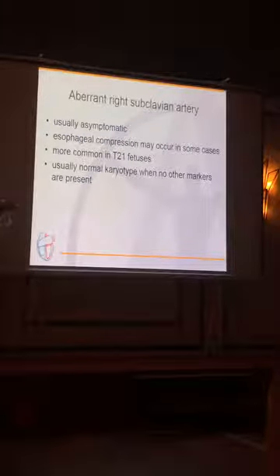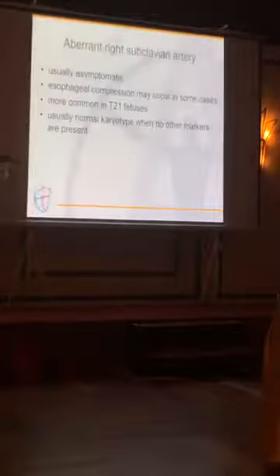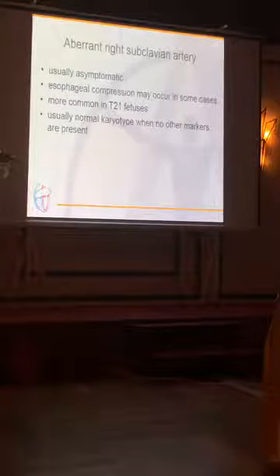So the circulation comes back through the vertebral artery, and in some cases what you observe is subclavian artery steal syndrome, and this is even more severe than just the existence of the aberrant vessels. So you don't have to be very keen on treating this anomaly in this way.